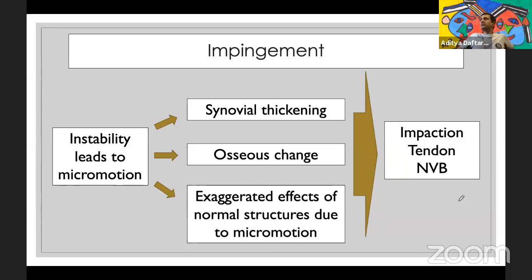Now, once we move from looking at the status of the ligaments to looking at the osteochondral lesions, what we see in a lot of patients, so a lot of patients who present to you with signs of anterior and posterior impingement, are just essentially a manifestation of ankle sprains that have been poorly managed. And when you have poor management of ankle sprains, not enough muscle recruitment or tendon recruitment, you tend to see an element of instability.